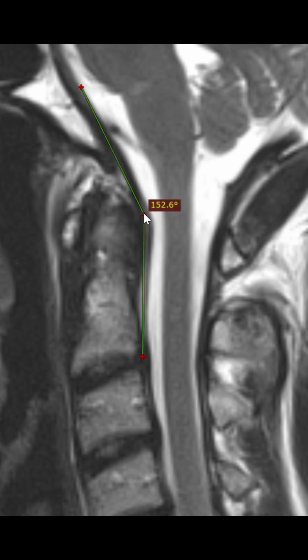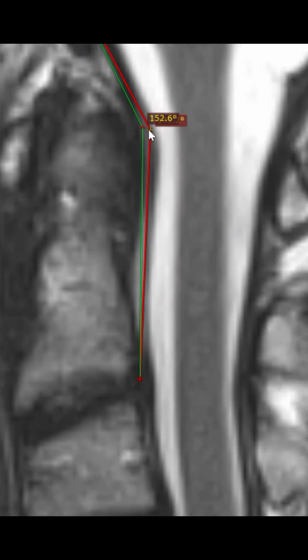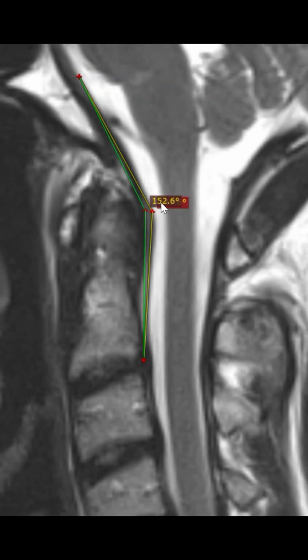So now if I do a soft tissue version that you probably see a lot of doctors do, because of course trying to find a dirty MRI, meaning the patient could have been shaking and things are a little bit hazy, let's just follow a dural version. So we're going to have the bone one here, and this will be a dural aspect. Some may just do it just like this. So look at the huge difference between those two.